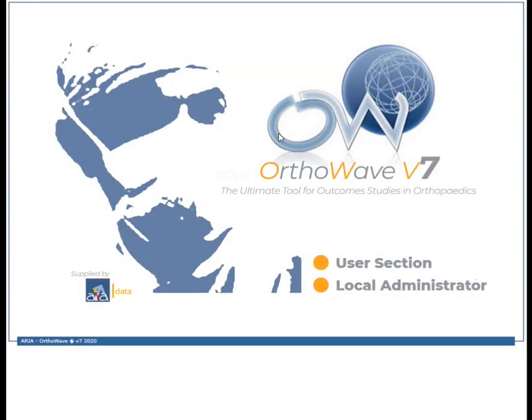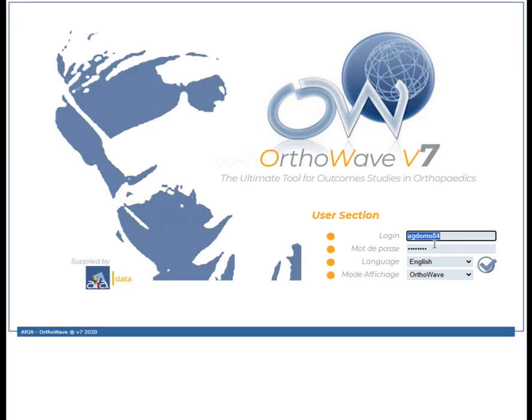This is version 7 of the OrthoWave academic software suite. You are entering the user section. Please enter your login and password.